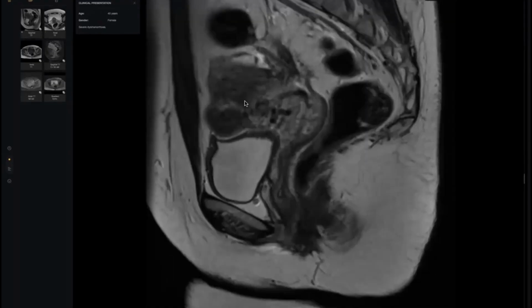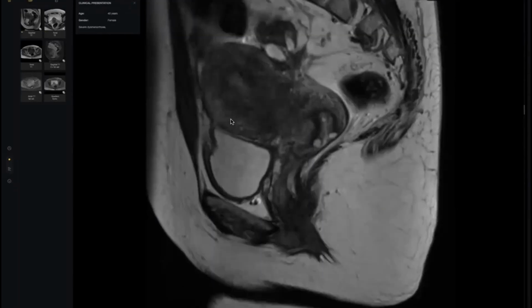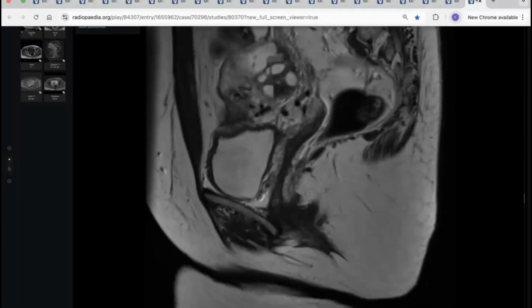My colleagues, don't expect in the exam he will give you one case of just a fibroid. Okay, my colleagues, look here. Look for the fibrosis. Look. Very characteristic. Okay, my colleagues. Thank you, doctor, so much. It was a difficult case.